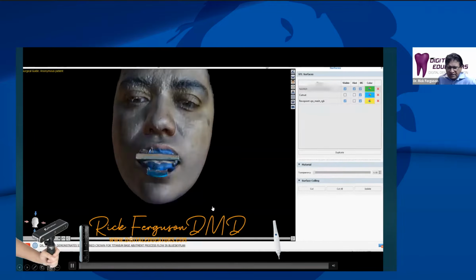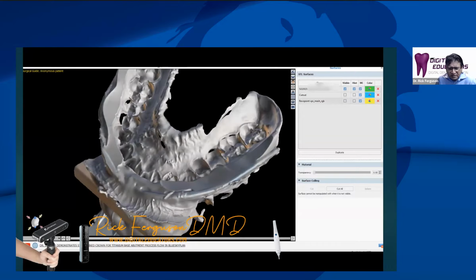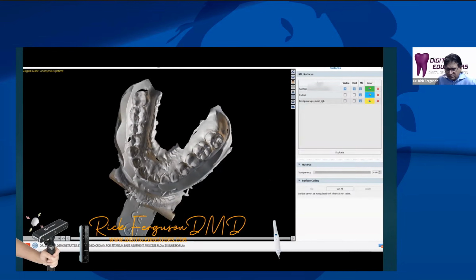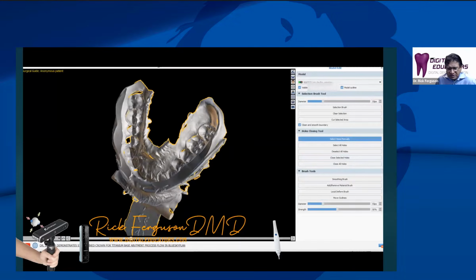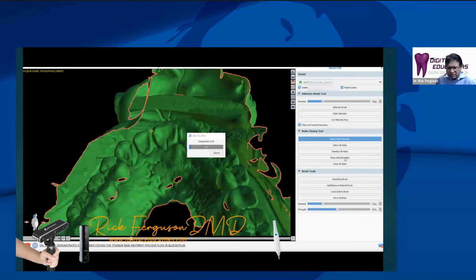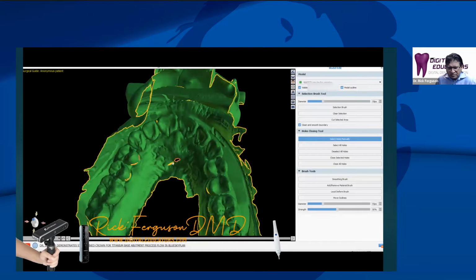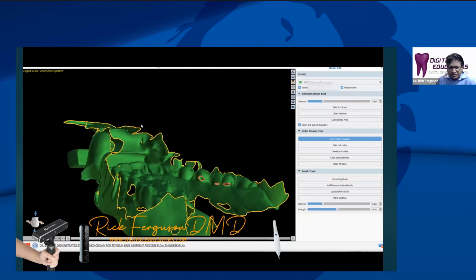So the next step now is to take this intraoral scan and clean it up, the intraoral scan of the impression. And by the way, you notice it's just a shell. I didn't scan the opposing side, and there were some holes. We kind of do this pretty quickly. We don't need all of the data points. So any holes that are in the scan of the impression, this was done with the intraoral scanner. If you have a desktop scanner, you can do it even faster.